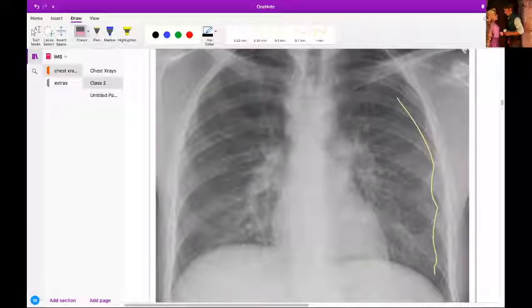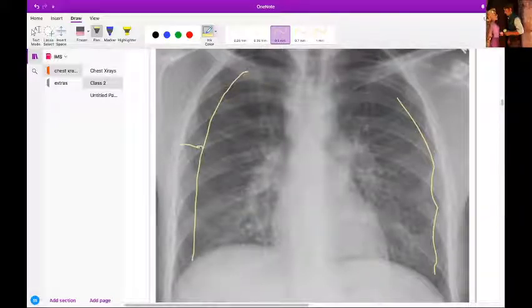Once more. So basically, in a normal chest X-ray, the pulmonary vascular markings will only extend to a certain extent, almost like a 1 centimeter distance from the pleura. Over here, this area will be relatively clear. There will not be any reticular lines which indicate the pulmonary vascular markings. But they will be present if there is diffuse reticular opacity. So over here, you can see this one, this one.